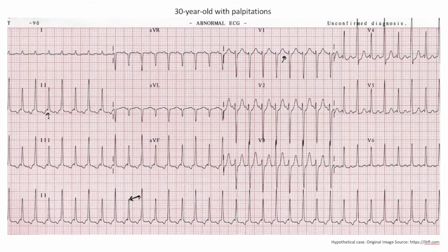reentrant tachycardia. Of further interest, notice how the voltage of the QRS complexes changes with each beat, but then it's not really a low voltage EKG. So this person does have electrical alternans as well.